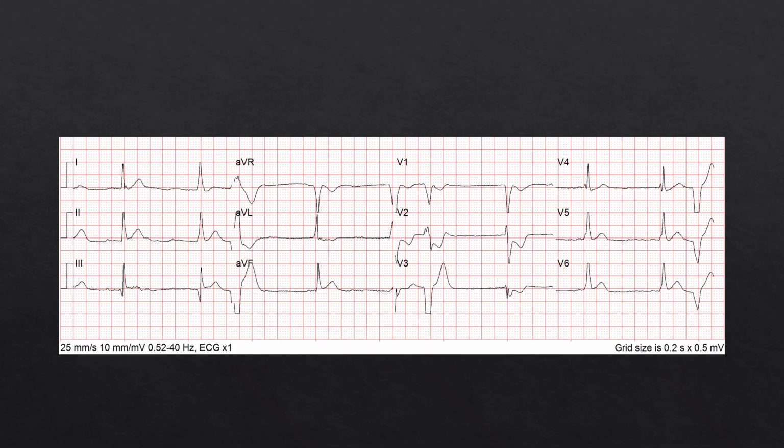Here's another example. This was the patient that had a corresponding RCA occlusion. So this was a sick patient presented in cardiogenic shock. They're also in a third-degree heart block, which should already tell you you're dealing with some sort of cardiogenic issue. And if we look here, this is a PVC, and we'll talk a little bit about how to identify it even in PVC, but you can see that ST depression there. And if you look at your underlying rhythm, we have ST depression here and here.